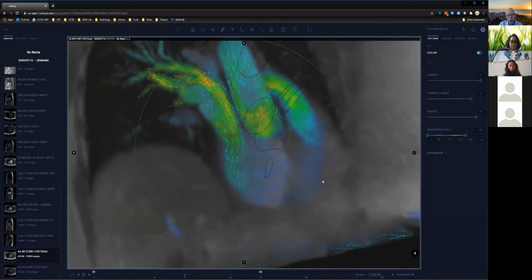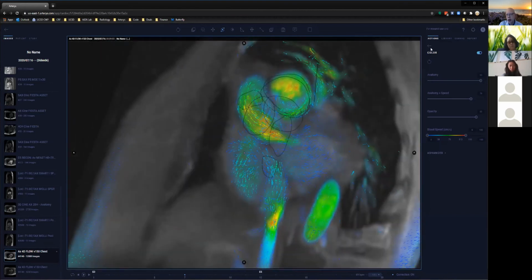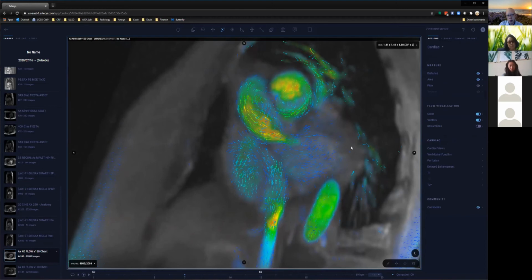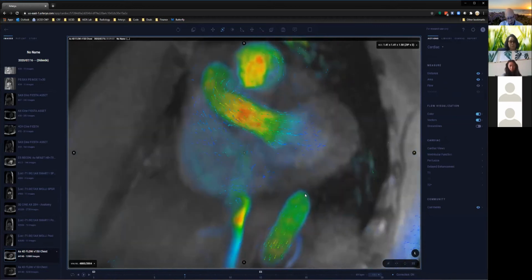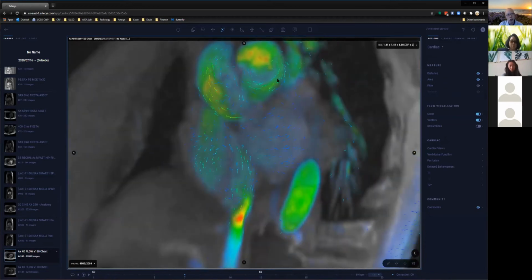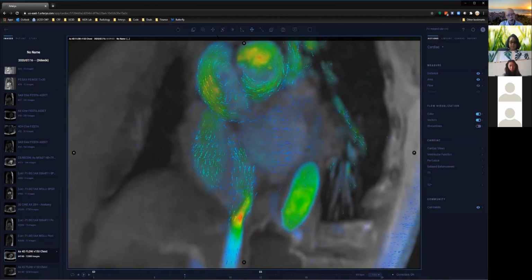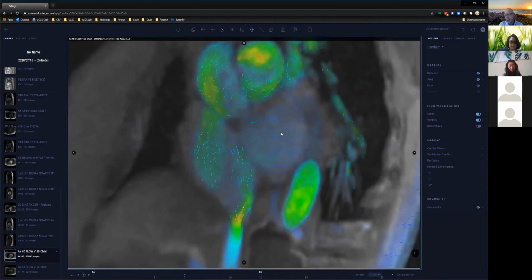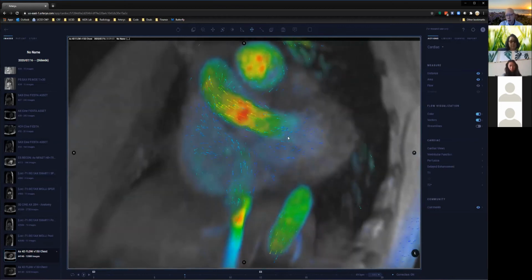The other thing that comes up, especially in a case like this, is whether or not there's an atrial septal defect. And in that earlier paper with Misha, actually, we figured out that there are a couple really great planes to interrogate. One of them is a natural interrogation of the atrial septum with the IVC flow.